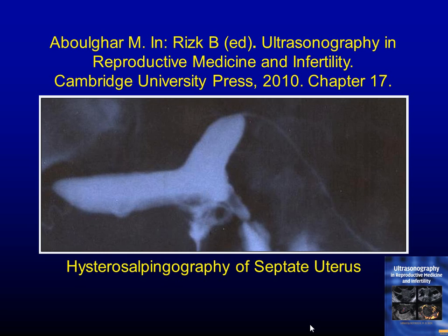They also measure that angle. So this angle, they say if the angle is beyond 120, then it is very likely that this is a bicornuate. Again, wrong. You can have an angle that is above 120, but still with that angle, you actually have a septum, not a bicornuate uterus as well. So those X-rays that I'll show you this morning suggest to you that hysterosalpingogram is a useful test to start with, but by no means a complete test.